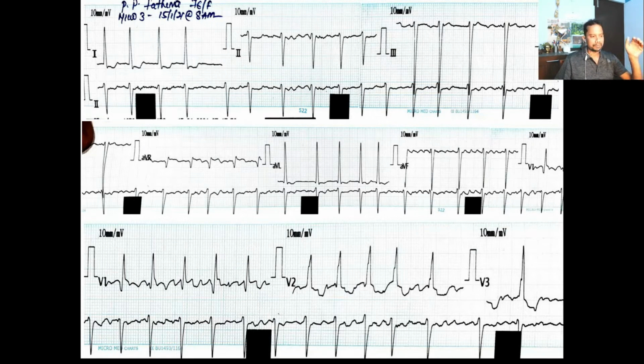Now I have told you left ventricular electrical activity dominates the right ventricular electrical activity, and this is what we are seeing out here. There is a right bundle branch block, but the axis is left axis deviation, and because this patient has LAHB also, the right sided activity is sort of suppressed. Okay, so there is a right bundle branch block with left anterior hemiblock, bifascicular block, atrial flutter with fibrillation, and there is an interventricular conduction defect.